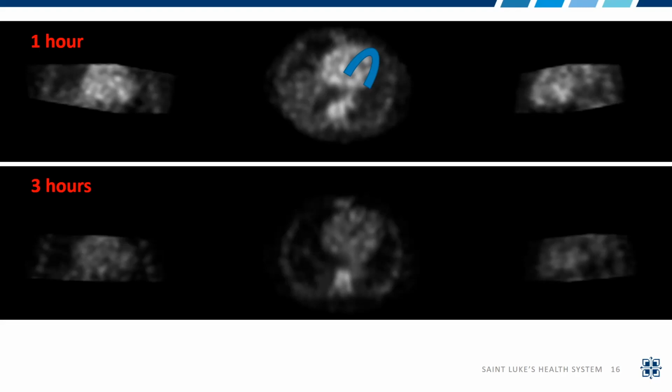And so it looks like maybe in 1 hour, you've got tons of blood pool, and in 3 hours, maybe that blood pool is diminished. So you might think, well, we're going to have some diminished blood pool, maybe some increased myocardial counts over that time. And we just haven't seen that that's the case. It's really that intensity difference between the bone and the blood pool. So you have to be careful. You might want to bring it up, scale the intensities of the blood pool or the potential myocardium to be equal. But like Dr. Sperry said, when you look at the 1 hour and you really see that blood pool, the cold spot imaging or the dark outline of the myocardium really stands out.